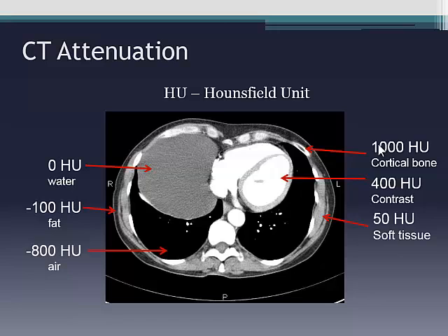What you can do confidently, for example, on CT is say when something's got fat in it. That can be helpful, for example, if you're looking at fatty metaplasia, maybe post-infarction. There have even been descriptions of looking for ARVC, for example, on CT imaging. So CT is a very robust way of identifying fat, and you're relying on this negative Hounsfield unit.